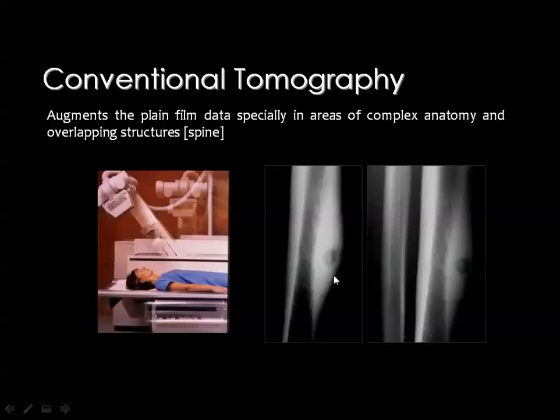And you know that this osteoid osteoma is usually associated with extensive periosteal reaction, which may mask the original lesion. At that time, we used to use the conventional tomogram to show the original pathology within the extensive periosteal reaction.